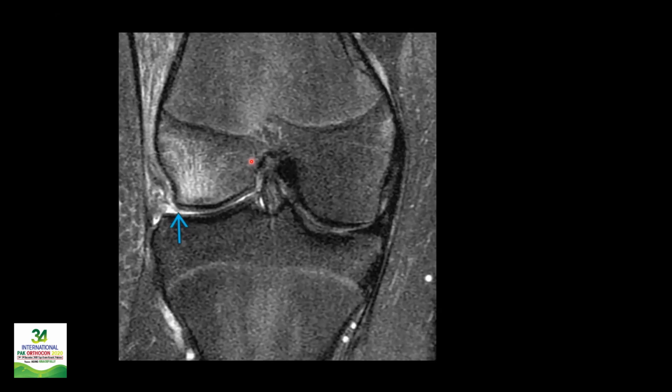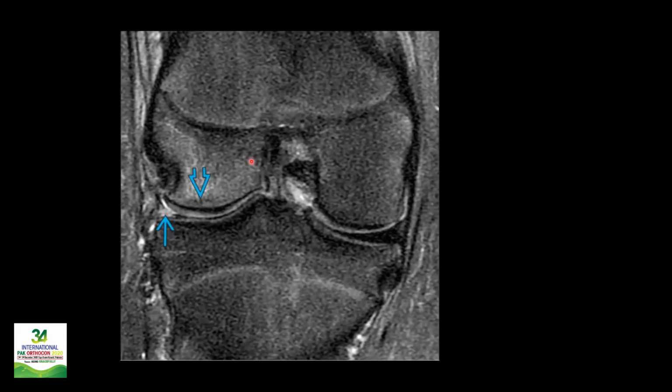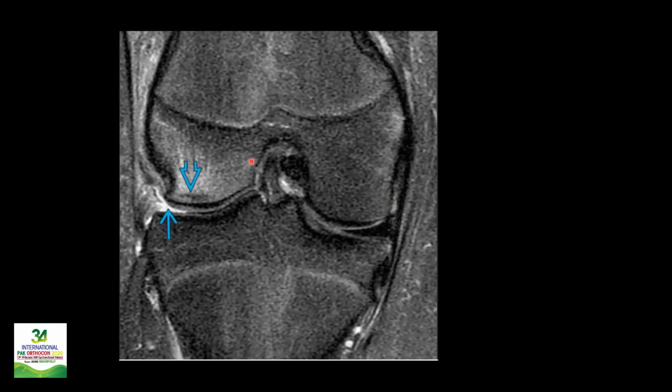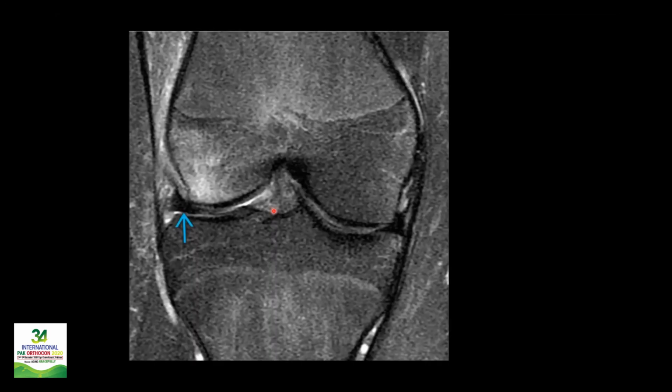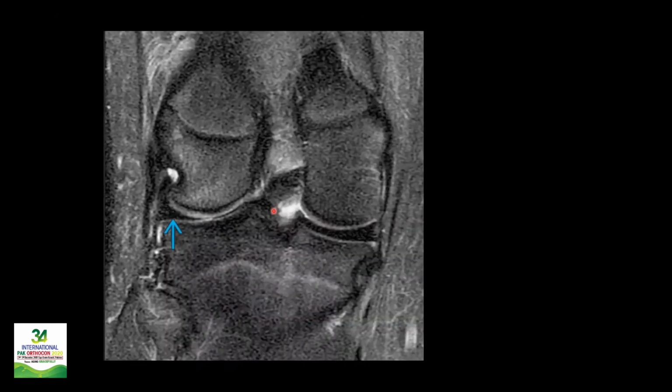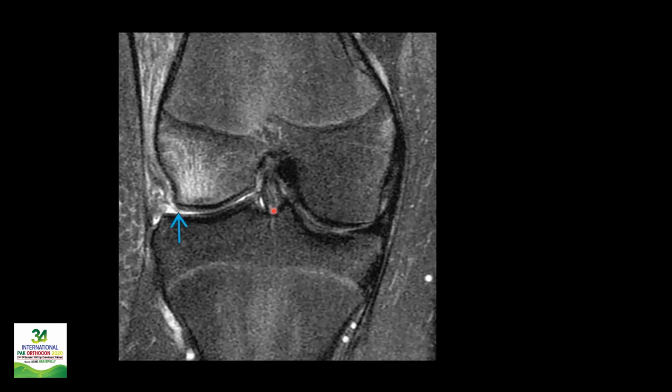So you remember which type of tear this was, where you are going to find an absent part of meniscus. So this is going to be a radial tear where you can extend all the way to the periphery. You can see this is the same image as well. So you have a defect within the part of the meniscus, which is going to represent in this way that you can see an absent part of the meniscus. So this is a radial tear.